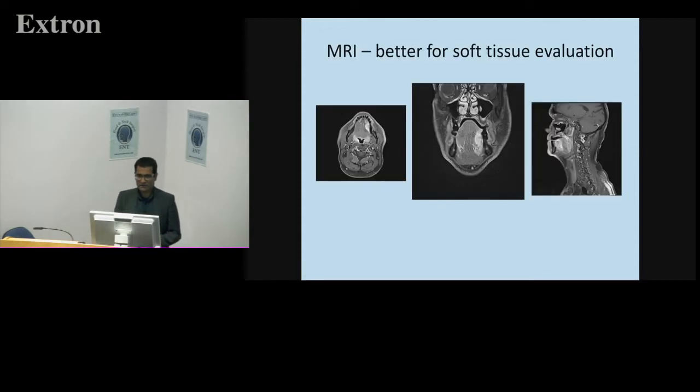So that's looking at the tongue tumor. This is a lateralized tongue tumor, and get used to looking at these images in the three planes, because what that gives you, certainly for me as a surgeon, is how much I need to resect. So you can tell on the axial plane here the tumor probably doesn't quite reach the midline. On the coronal, you can see the extent, whereas if you look at the sagittal section, it goes quite deep.